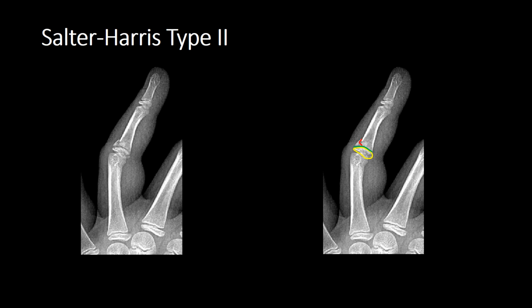Just have a quick look at the physis of the index, of the middle finger. You can see that there's apparent diastasis, and this is just down to the projection. It mustn't be misconstrued. So what I would strongly recommend you to do is to really familiarise yourself with the normal appearances of a DP and a DP oblique hand, so that you're familiar with how the different overlapping structures appear.